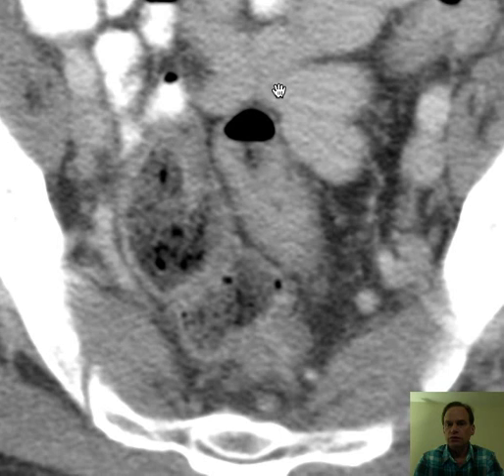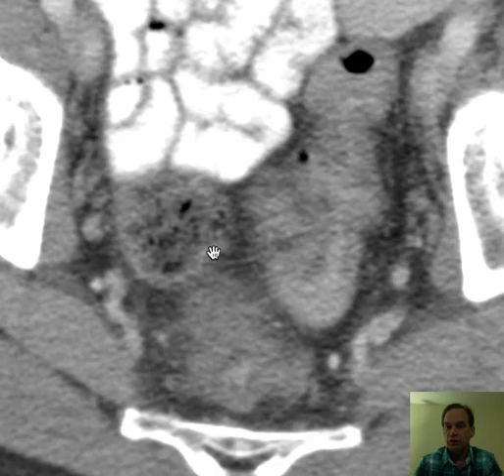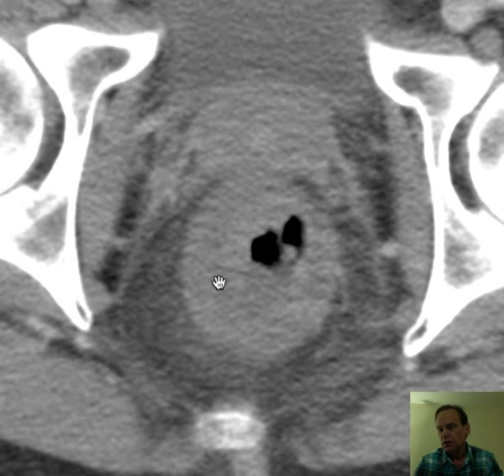Then I looked at the old study and realized the patient had had proctitis, inflammation of the rectum, before. So we go down here and I think, well, this is a pretty good looking sigmoid colon. Here is rectum, and not too bad. And then if you keep looking, oh my goodness, here you've got this big donut of a thickened wall of the lower rectum. And very importantly, look at the edema, look at the stranding or the fuzziness of the fat.